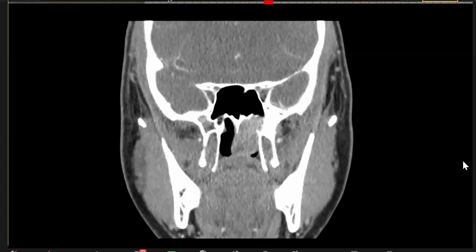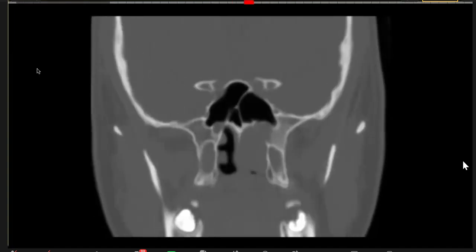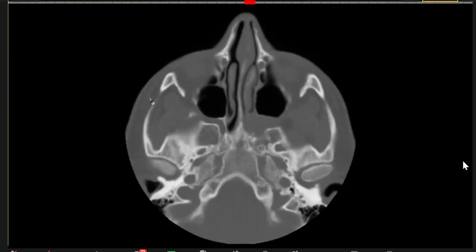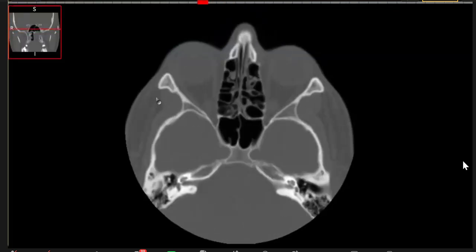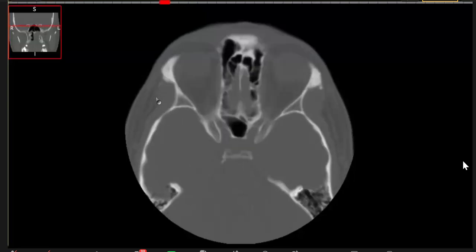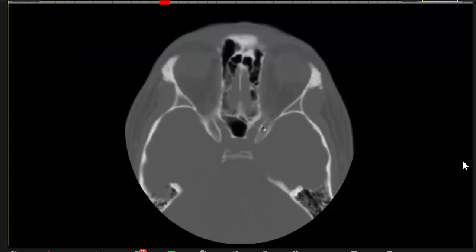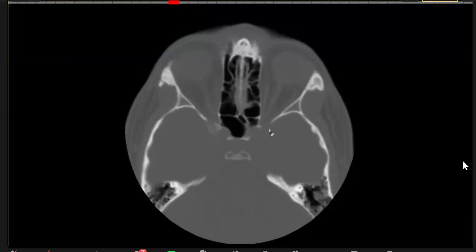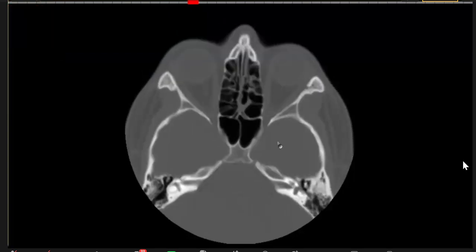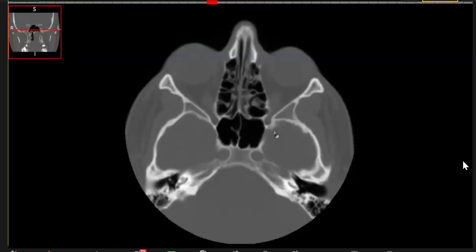Okay, thank you. Thank you, sir. So the only thing is anatomy. And in anatomy, you have to be very careful what you are pointing out. And you know, this kind of a scenario with a 17-year-old with epistaxis is a giveaway. So if you see, this is the optic nerve, and this is the superior orbital fissure, and then this is the middle cranial fossa.